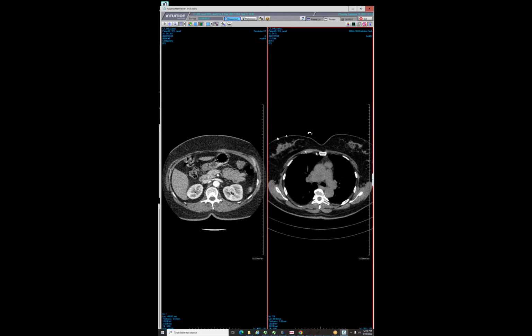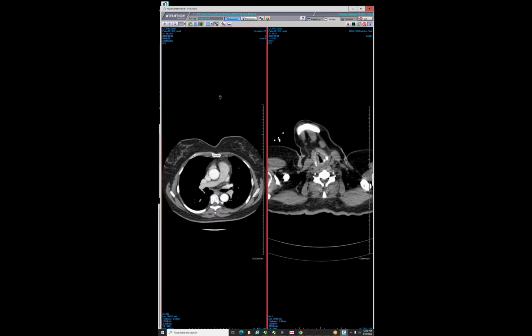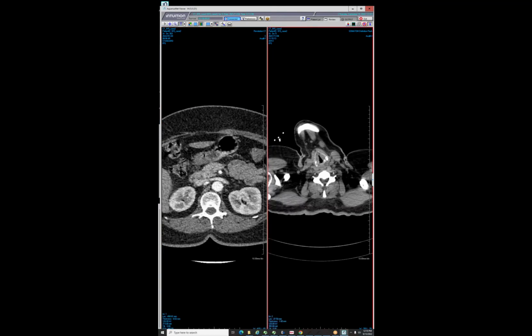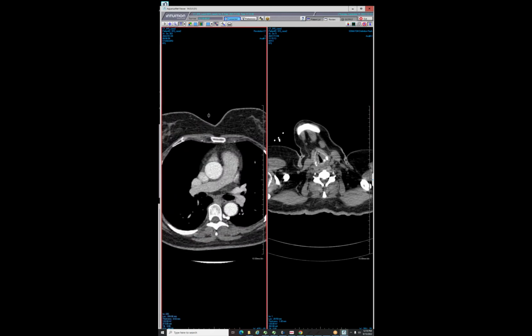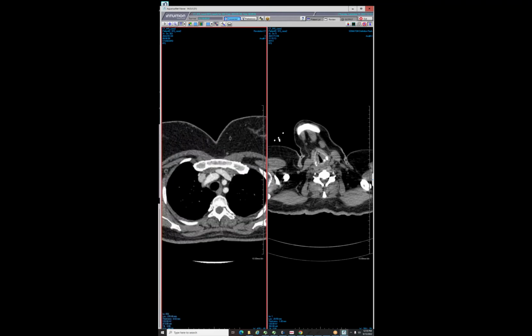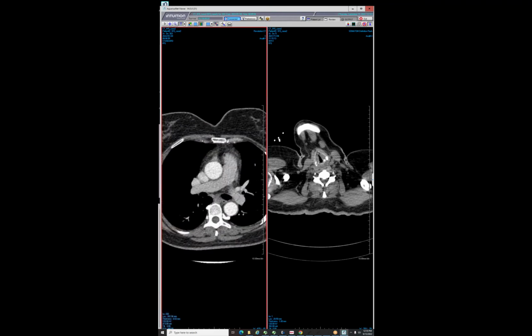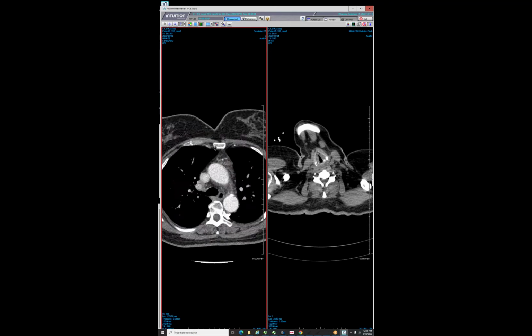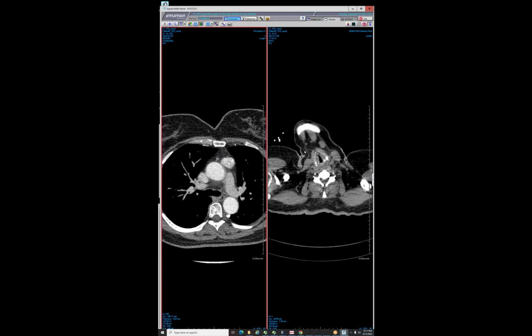This is the differential with this little nugget in the anterior mediastinum, and then on delayed imaging, arterial phase imaging, very avidly enhancing, and thought to be a paraganglioma, which is a good guess. There's some feeding vessels coming out of it, actually more draining veins. But anyways, this has a differential. I mean, it could be a very large parathyroid adenoma. Could be a thymoma, given the patient was in her 50s or 60s, just an avidly enhancing one. Then you get into the weird ones like Castleman disease and hemangioma, and this was taken out. This was just a hemangioma, so an anterior mediastinal hemangioma.